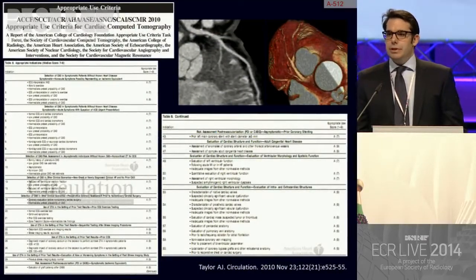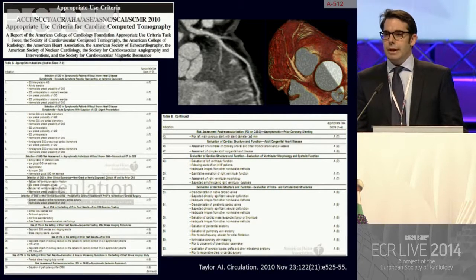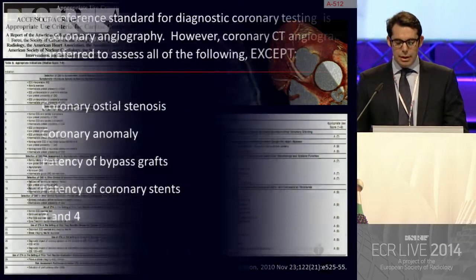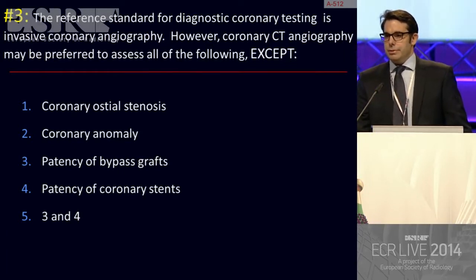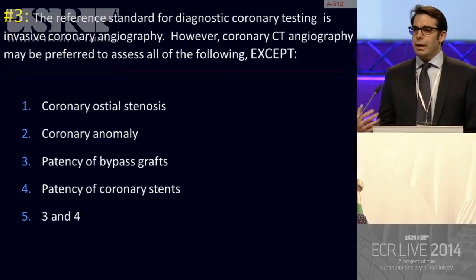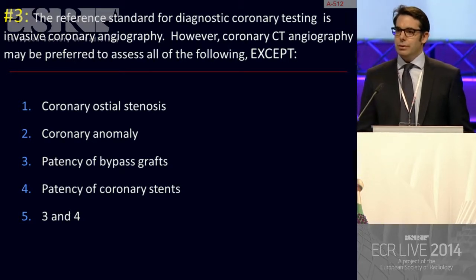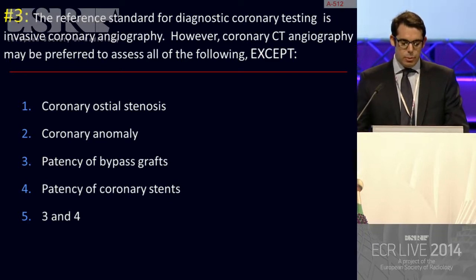After these two initial imaging cases regarding the anatomy, let's move to the indications of cardiac CT. Let's see what can happen to us in our daily practice. And we know that the reference standard, when we are trying to assess whether there is significant coronary artery disease, yes, no, and its significance, is the conventional coronary angiography. However, in daily practice, we see that sometimes this is not the real gold standard, and that CT is a good gold standard for that. And I think that it happens in all of these except in one.